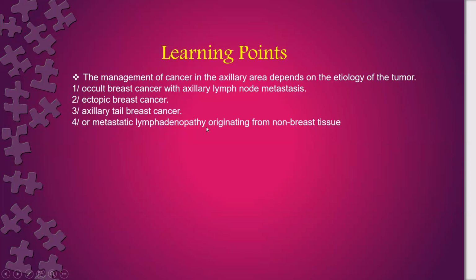If it is a lymph node, it is very unlikely for a lymph node to have spiculated margins like this; it simulates the primary cancer more than a metastasis. But if it is metastatic and it is irregular and there is surrounding edema and architectural distortion, it denotes that the lymph node has a capsular break and extracapsular extension of the cancer.